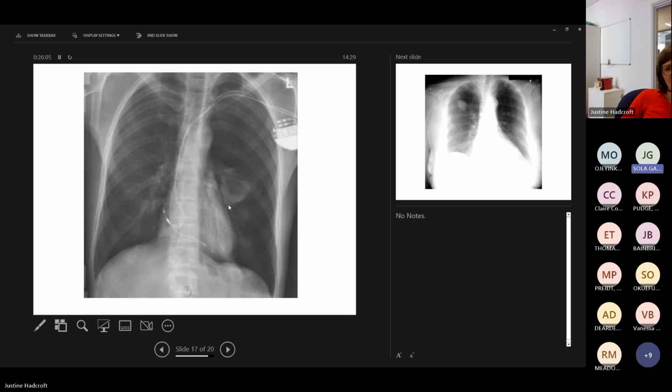Definitely a pacemaker. Yeah, so you can see these wires here, can't you? There's this wire there and then that wire there. It's probably left ventricle, right ventricle. And these wires come together here, and that's a battery. So this looks like it's a pacemaker. So somebody's had a pacemaker put in, and what's happened, I think, as a result of the pacemaker? Can anyone pick that out?